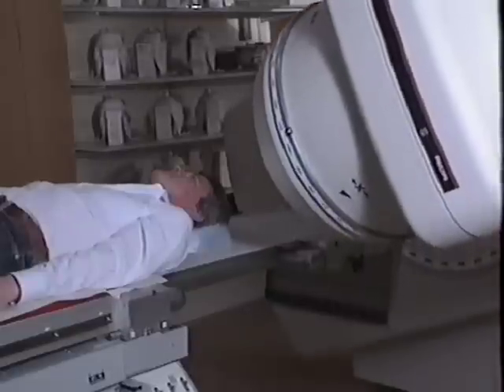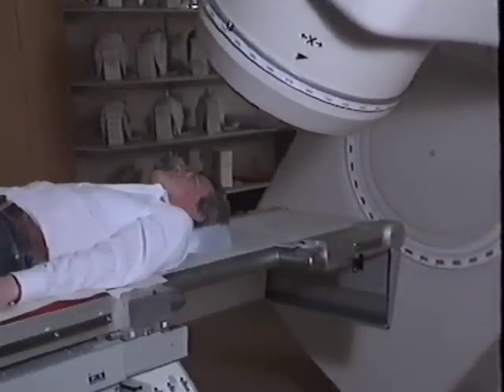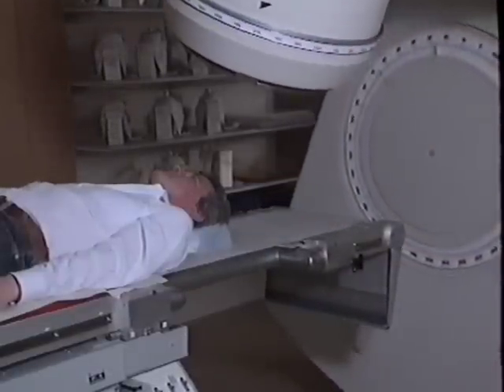TMS is the challenge of the next decade for better planning of radiation oncology. The key words are easy handling, flexibility, consistency, and accuracy.